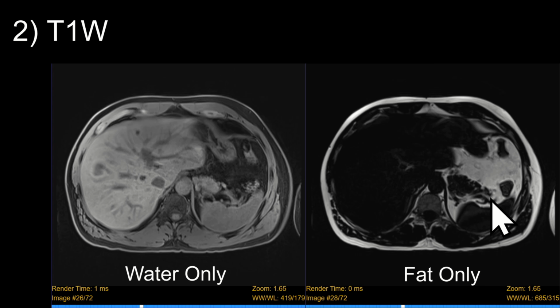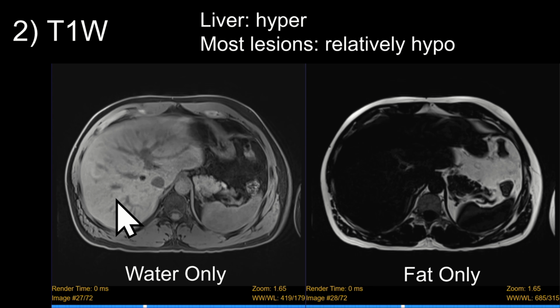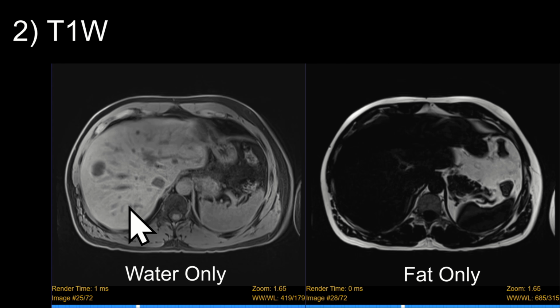and fat only images. So the water only image is a nice T1 fat suppressed image. Notice that the fat is very nicely suppressed over here on this image on the left. Also notice that the background liver here is actually pretty bright on these T1 weighted images. So most lesions are going to be relatively hypo-intense to background liver, but also things that are very T1 hyper-intense are going to stand out nicely on this T1 weighted fat suppressed sequence.